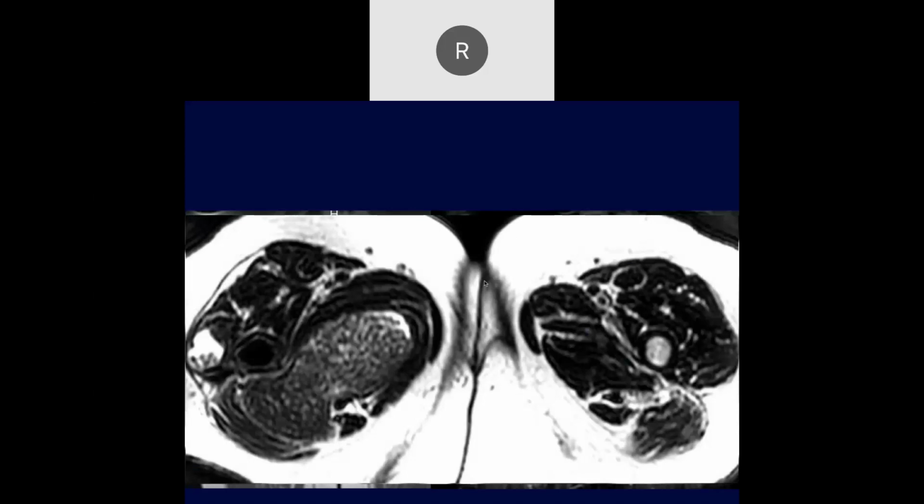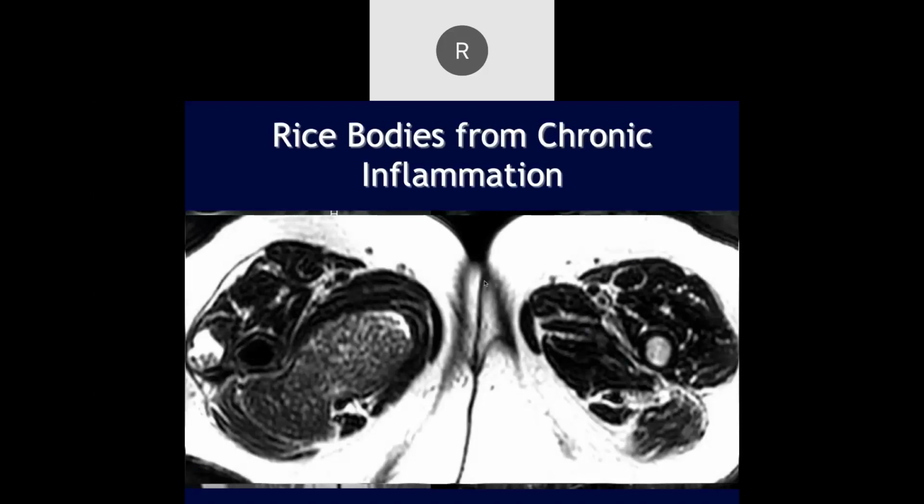Yeah, there's rice bodies. And so these turned out to be not bony. These are all rice bodies from chronic inflammation from a chronically loose prosthesis.